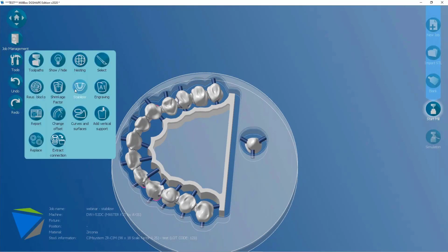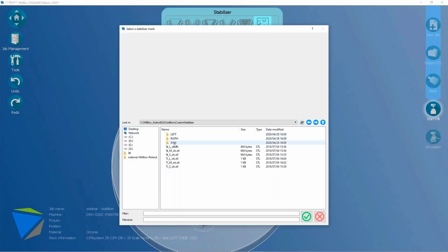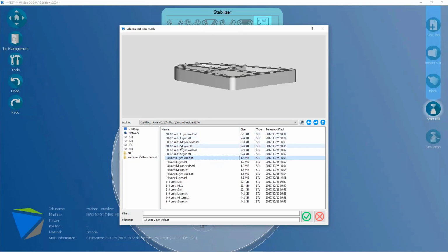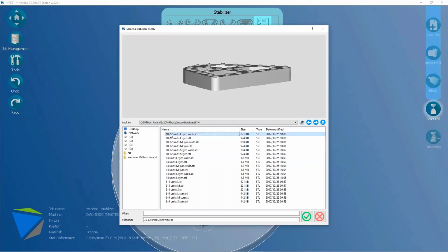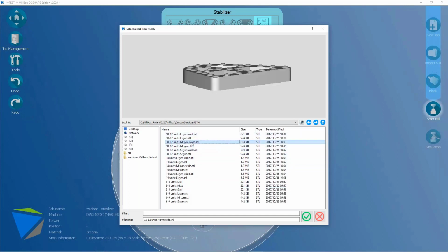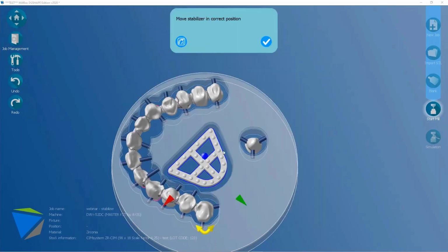Now you have the chance also to import, if defined in your library, other kinds of custom-made bars. For example, depending on the dimension, depending how many units, for example, from 10 to 12, or 3 to 4, for small bridges, for example. So it depends. The different shapes and dimensions, of course, very easy, just select it and load. Automatically the system imports it.